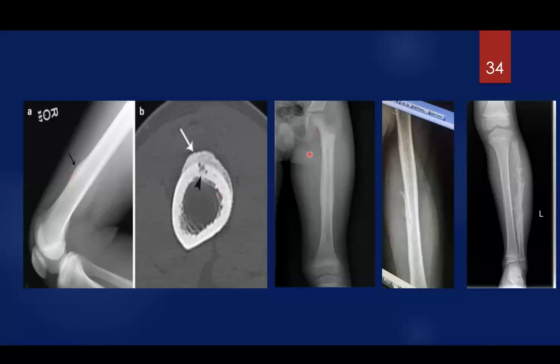This patient, again, is my patient, has a periosteal reaction, and you look, Codman triangle, a very small Codman triangle. There are multi-layer periosteal reactions over here, and this is Ewing sarcoma. And this patient is one of the very first patients that we treated. She's a female patient, and this is Codman triangle. If somebody looks at these X-rays in a GP clinic, probably he will discharge her.